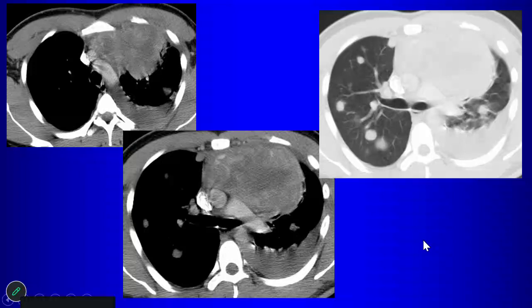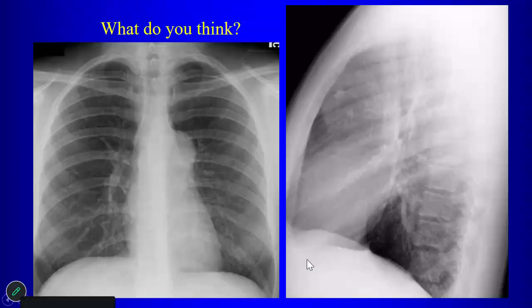So these malignant germ cell tumors tend not to occur in females. They're almost always male patients. Another patient here, where's the mass? Anterior mediastinum. Surprise, surprise, anterior mediastinum. There's another feature here that's helpful. What is it? In terms of telling me what this is, what's the other feature that we see?